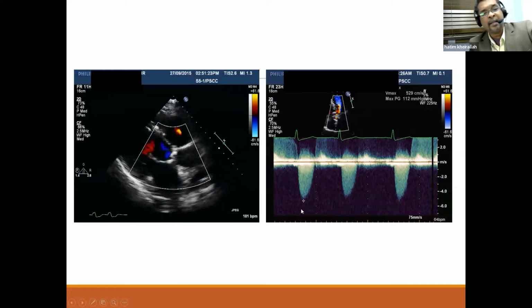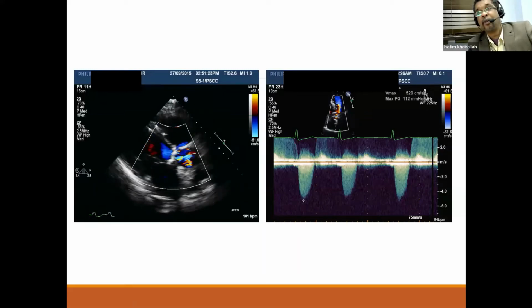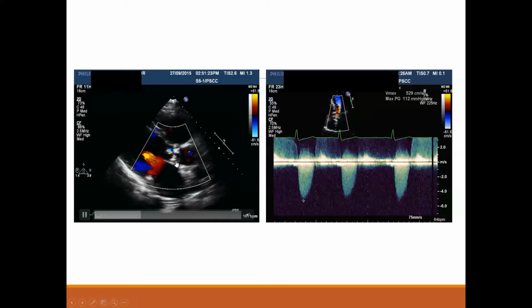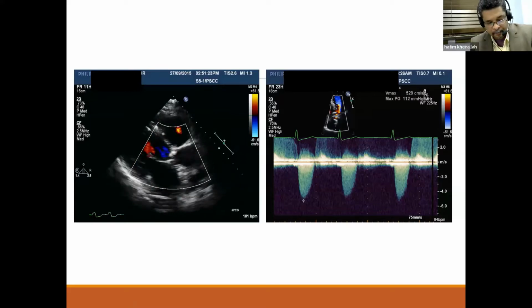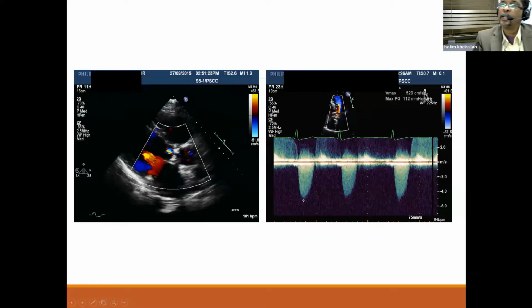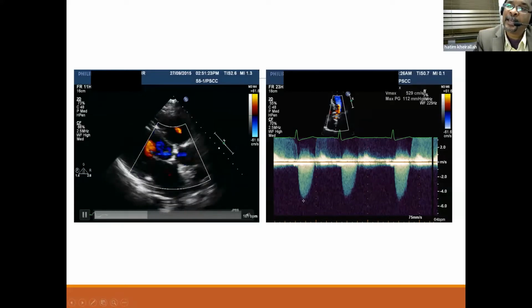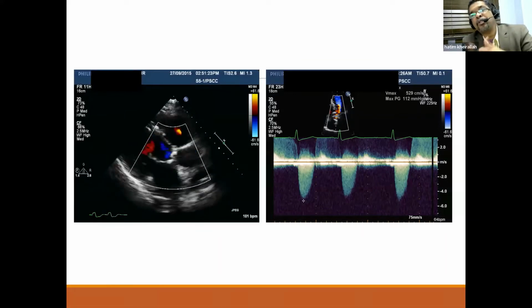Okay, and in this case, the way out is what? What's the way out in this scenario? A scenario when you have a morphologically stenotic valve with LV dysfunction, but the gradient is less than 40. Dobutamine stress echo. Yeah. In this case you do the dobutamine stress echo in an attempt to activate the contractility and to normalize the flow across the valve and to elicit a higher gradient. So if you achieve that, it means you have truly severe aortic stenosis. Okay, but this is important.